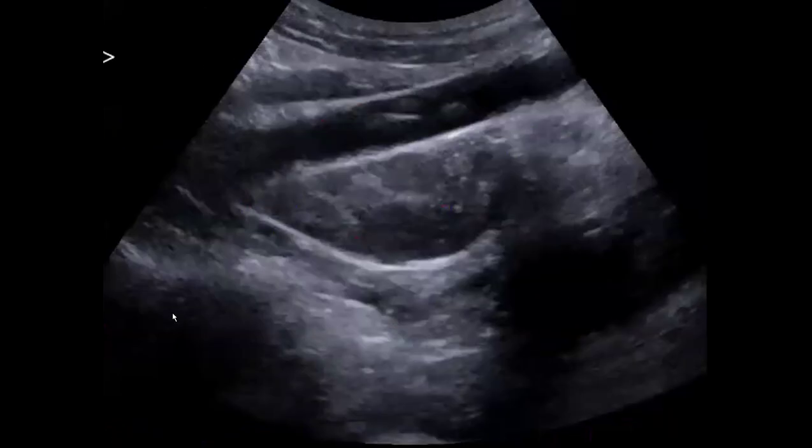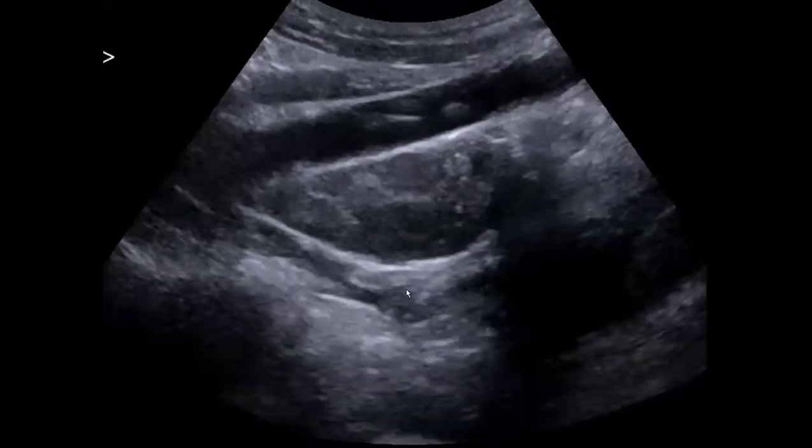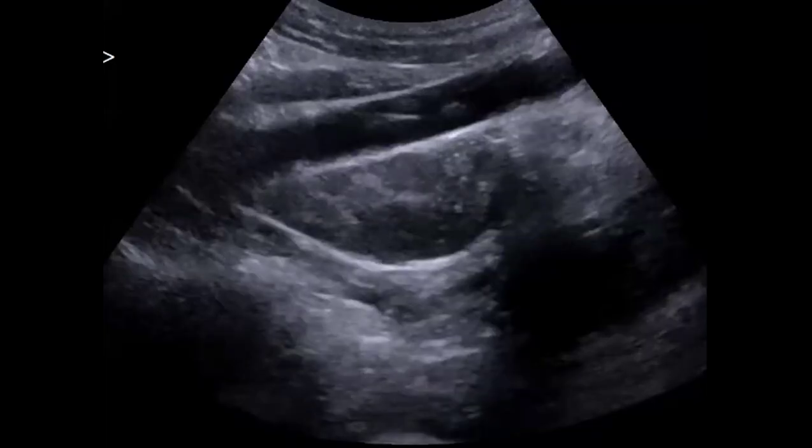So what are your thoughts now? What could this be? Primary amenorrhea, no uterus. Is it androgen insensitivity syndrome? Yes, androgen receptor insensitivity syndrome. Perfect. So these are undescended testes, but the question is, what are these hypoechoic nodules that you see in the testes? Well, pelvic testicles are at increased risk for developing testicular malignancies.